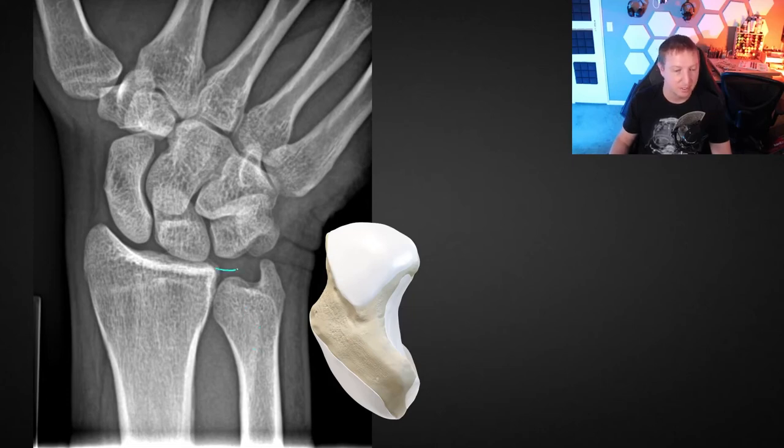All right, so this one is probably under 2 millimeters. It looks like it's on the fence, maybe a millimeter or so of negative ulnar variance. Again, we follow down the main sclerotic portion of the articular surface, and we're measuring right from the edge of the sigmoid notch. The edge of the sigmoid notch is here, so we draw that across and compare that to the surface of the ulna. That's how we measure ulnar variance.